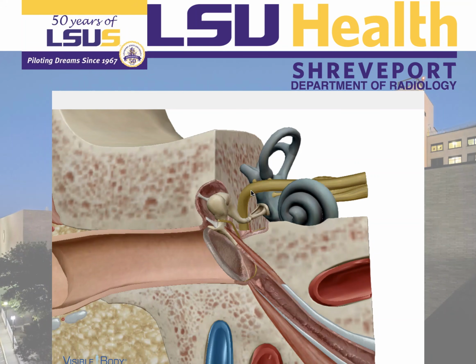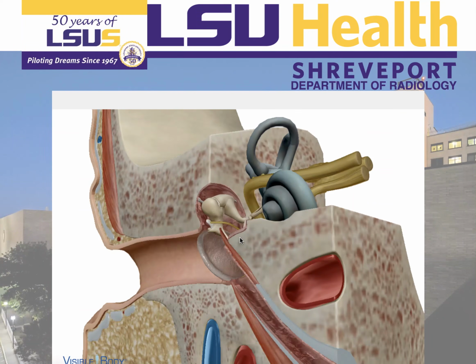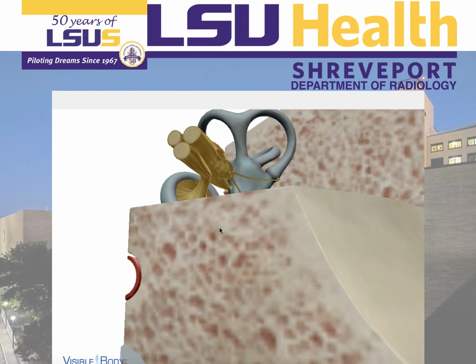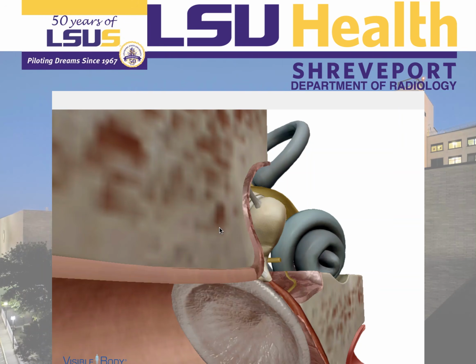The facial nerve is here in the inner ear, and it has a small branch that goes to the middle ear. That is the chorda tympani. Okay, here you can see better the chorda tympani, the tensor tympani muscle attaching to the malleus. We're gonna talk about the inner ear afterwards.